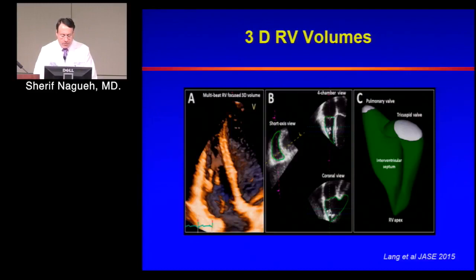And then you end up with a model for the right ventricle like the one you see here in green. So you have the tricuspid valve, you have the pulmonic valve, and you have end-diastolic and systolic volumes. For labs that have done the validation work against cardiac MR, they show good correlations. Again, variable ranges, anywhere from an R of 0.6 to an R of 0.7 to 0.8, but still some degree of underestimation of RV volumes. The normal cutoff for RVEF is around 45%.